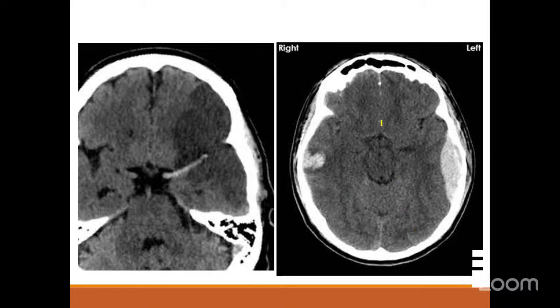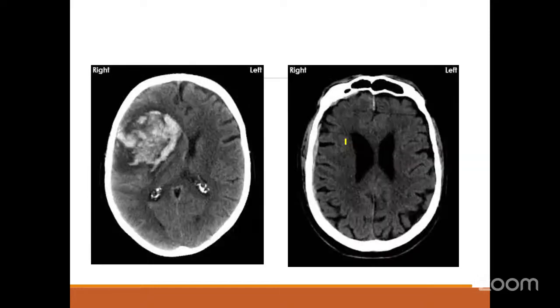So all these signs suggest that there is an impending rise in intracranial pressure, an ICP-induced crisis that needs to be addressed either medically or surgically. So apart from identifying the lesion, also look for complications arising out of these lesions, like raised ICP or signs of raised intracranial pressure. See, this is a clear example for this.